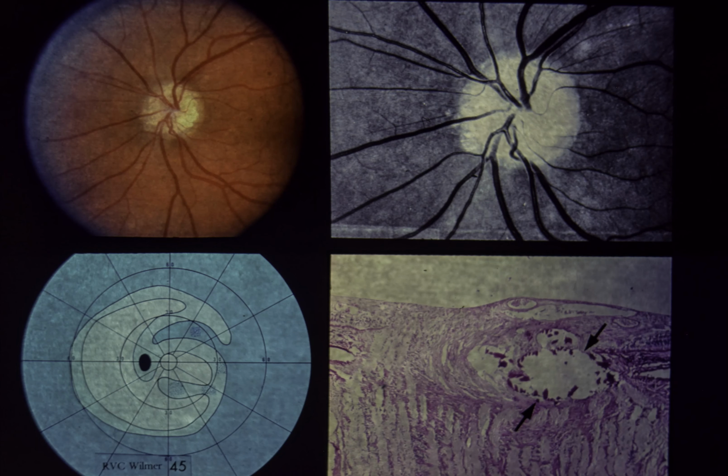Slide 45. Optic disc drusen and visual acuity loss. This 52-year-old female complained of blurred vision in both eyes. Visual acuity was 20/30 OU with slightly decreased color vision. Pupils were normal. Upper left. The left optic disc shows numerous drusen just beneath the nerve fiber layer. The disc is pale yellow and the retinal vessels are normal.